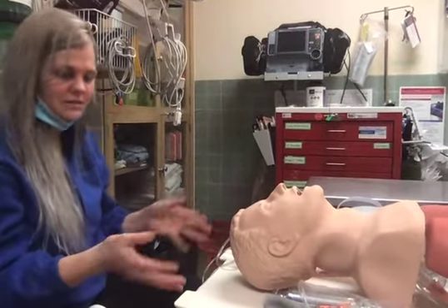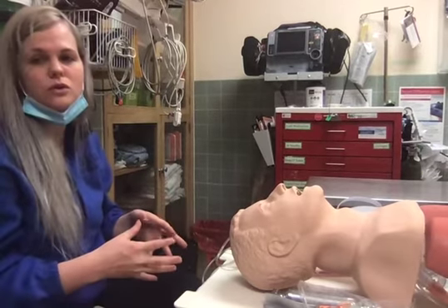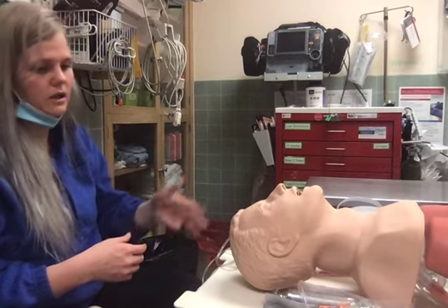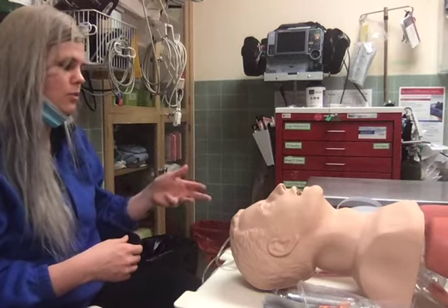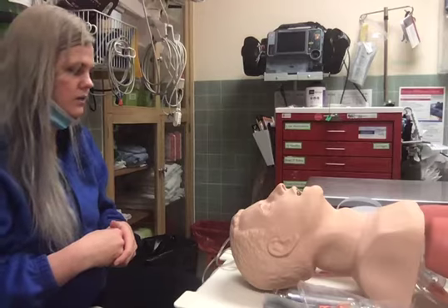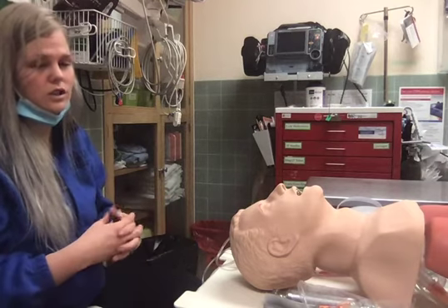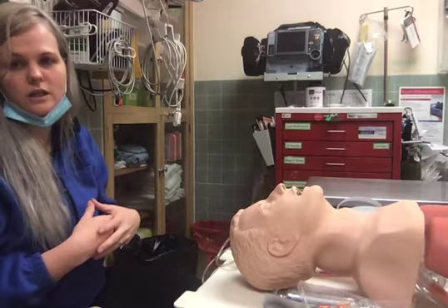So in conclusion, we've gone through some different equipment that you use for your airway management, going all the way from your nasal cannula up to your intubation, as well as your adjuncts such as your OPAs, NPAs, King tubes, etc. We've also gone through some of the different types of ventilation or oxygenation support that you would use from low flow all the way to endotracheal intubation.